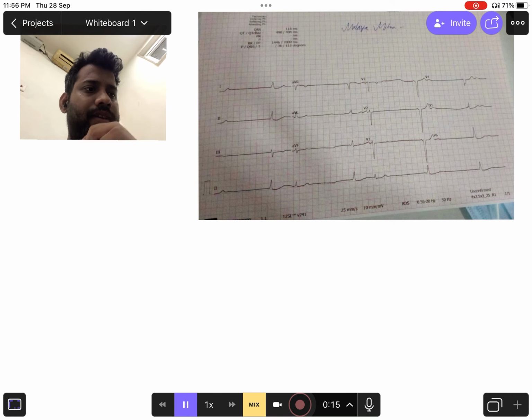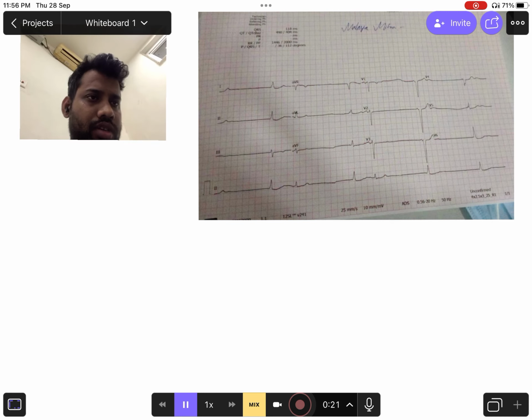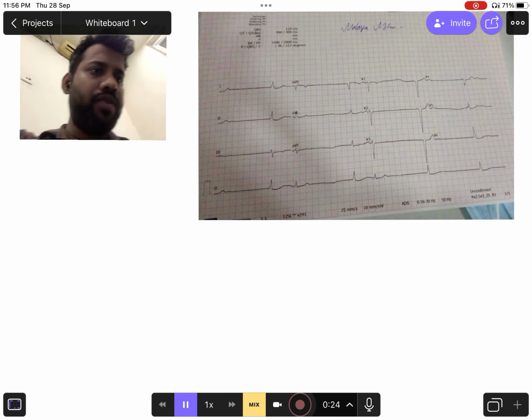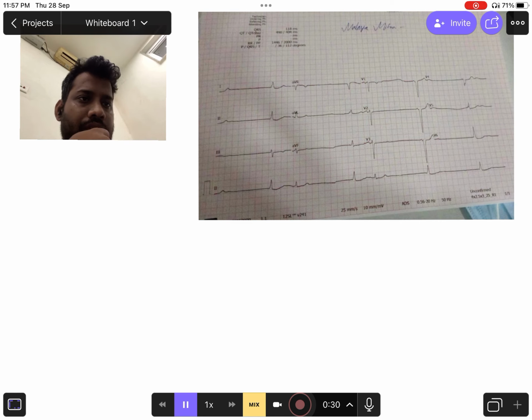Another important video, another important ECG. This is an ECG of an old patient who came to the ED with a history of syncope. One episode of syncope was there, and there was a history of many episodes of pre-syncope in the last 3 to 6 months.